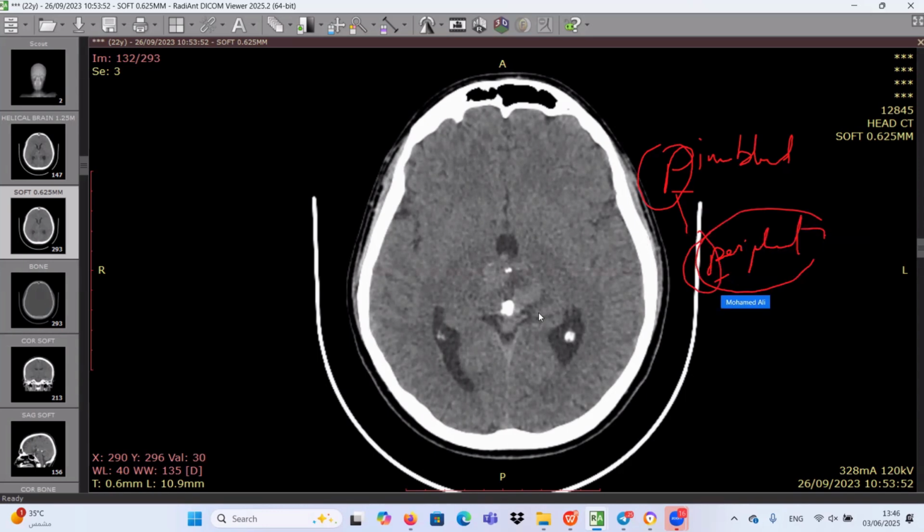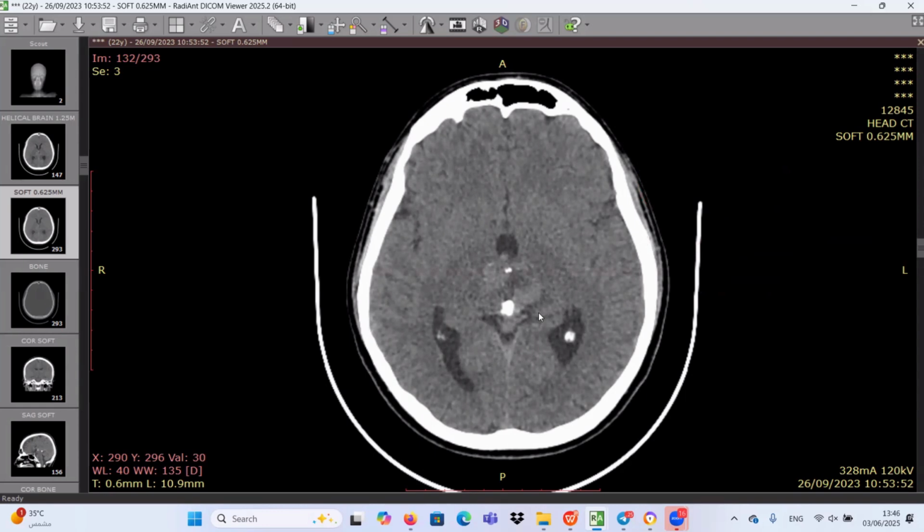Okay. Yes. Also, the next step, you should do MRI for the whole spine with contrast, for the whole neural axis, to exclude leptomeningeal metastasis. Okay. That's good. Our differential diagnosis in this case also includes pineal meningioma and pineal metastasis. I think pineocytoma is far away because pineocytoma is most likely a predominantly cystic mass.